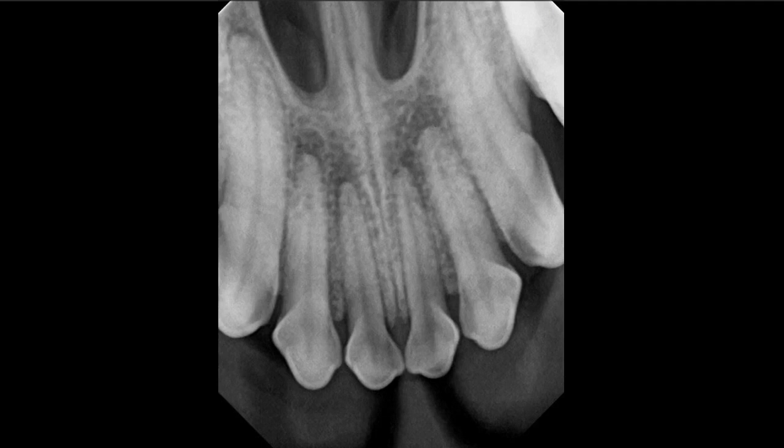And if there's any question, you need to get the patient back, reevaluate radiographically in 6 to 10 to 12 months to see if those changes are progressing. And these here, looking at that, I would say those are perfectly normal and would not make any recommendations other than to maybe re-radiograph in a year or so, depending on how old that patient was.